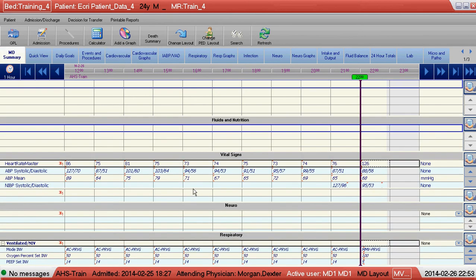Another possible use you might find for this is to take the temperature and the MAP and trend them together, or place them side by side so that you can see what's happening. Or if you want to see what their oxygenation is, you can tie the blood gases with the ventilator, or their FiO2 with the ventilator, or their PCO2 or their SATs. It's just that easy.